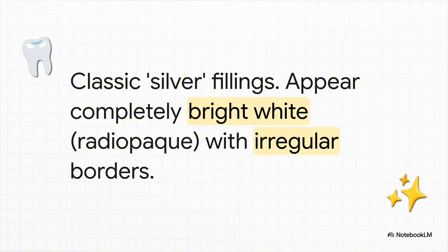And here's a key giveaway. Look for those irregular borders. It almost looks like someone packed it into the tooth, which is pretty much what happened.